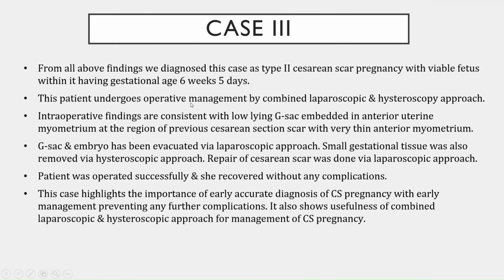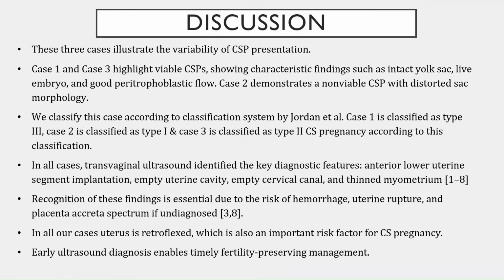This patient underwent operative management by a combined laparoscopic and hysteroscopic approach. Most of the products of conception, the GSAC and embryo, were evacuated by the laparoscopic approach, but small gestational tissue was also removed by the hysteroscopic approach. So this case highlights the importance of early diagnosis of caesarean scar pregnancy and shows the usefulness of the combined laparoscopic and hysteroscopic approach for management of caesarean scar pregnancy.